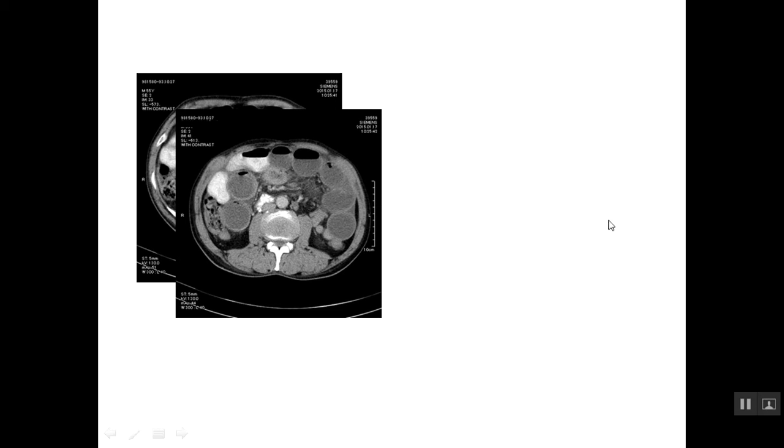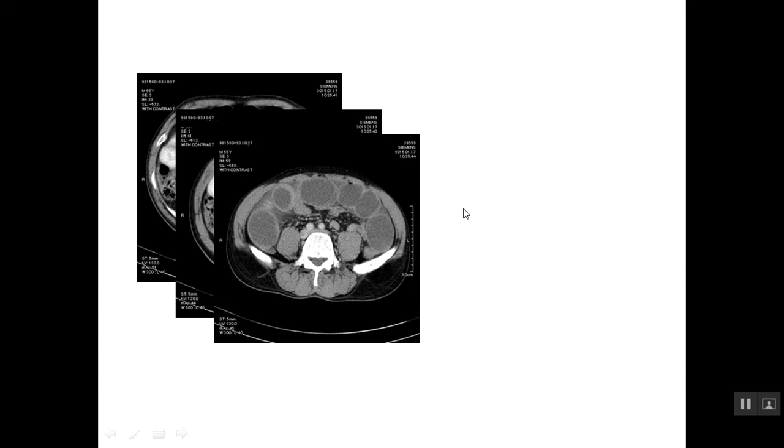The pattern of the dilated bowel loops is a clue to obtain a better or final diagnosis here. In the next image, you can also find dilation of bowel loops without wall thickening, except for a change here which shows slightly increased diameter.